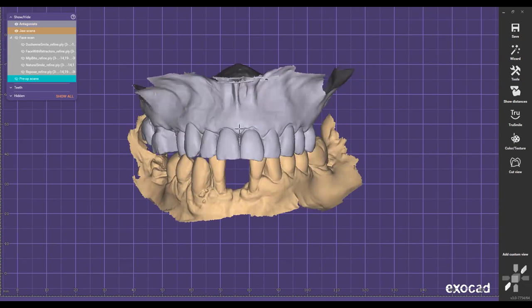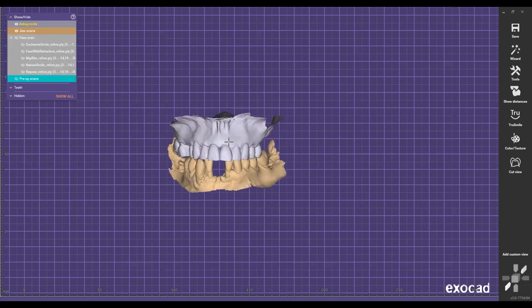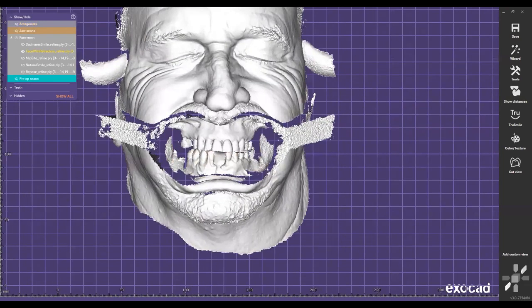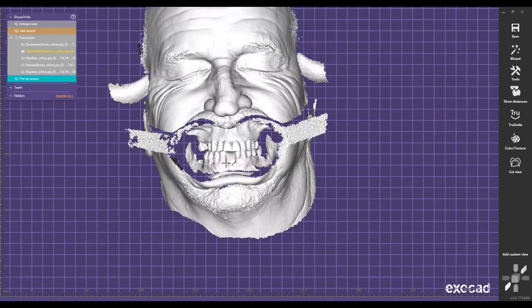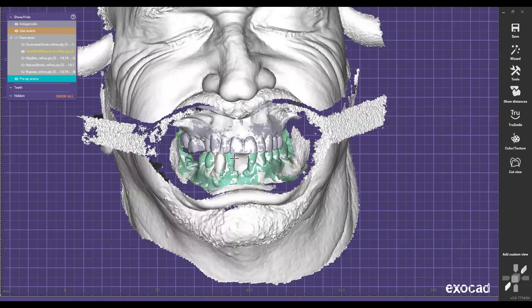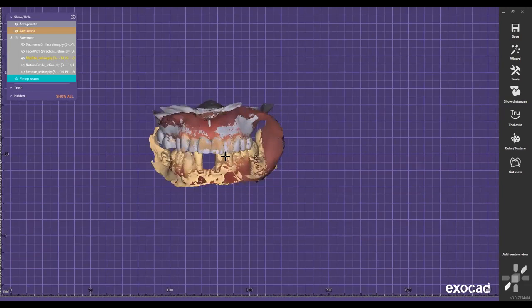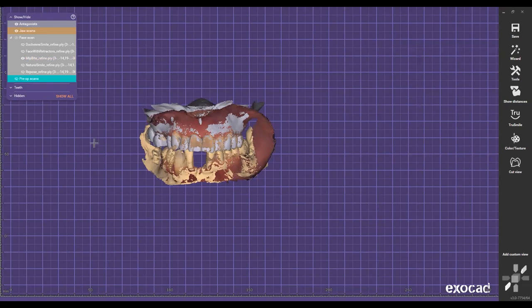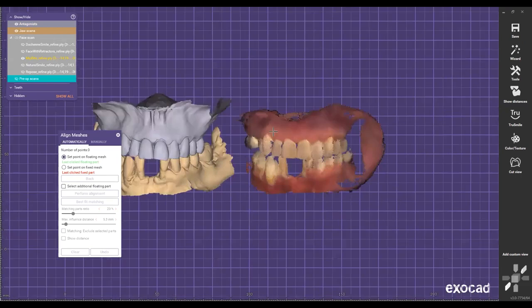Okay, perfect. So now we have the intraoral scans here, right? Upper and lower. The nice thing about our facial scanner is that it's able to scan the teeth in high resolution, right? You can see that our facial scanner scans the teeth, and that's how we are able to match all the data together, because we're able to scan the details of the teeth on the upper and the lower, and that's how we can match the bite too. Our facial scanner is not just a facial scanner, it's also a bite scanner. What I mean by that is we're able to scan the bites directly, especially for intake records. We are able to scan this bite with color from the facial scanner.